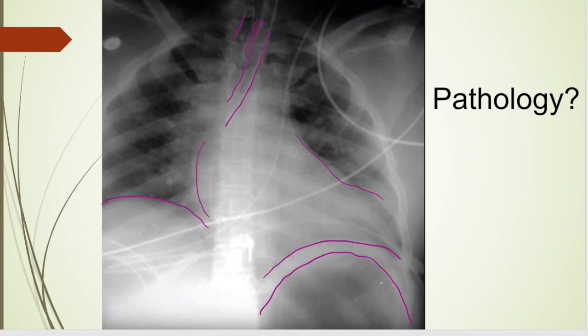And I wonder why. When we think back to that clue, we have an endotracheal tube next to the trachea, so it's probably in the esophagus. So this patient's having a really bad day. He obviously still has his lungs somewhat inflated. We see now why this left-hand side, the volume is so low. Right is a little bit better, but he has an endotracheal tube in the esophagus instead of the trachea.